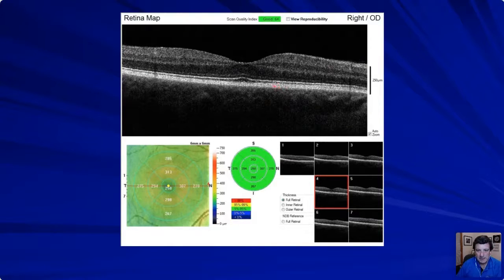You can kind of see right in here, this RPE complex is kind of separating out. And again, your outer segments. And then I always like looking really closely at these mitochondria, that inner segment. There's lots of names for them, so I'm just going to keep repeating them. Inner segment, that ellipsoid zone, because those are the mitochondria.